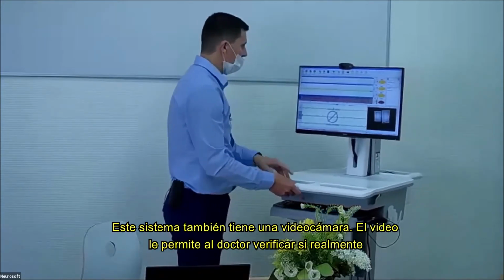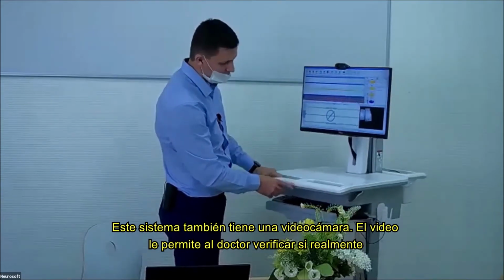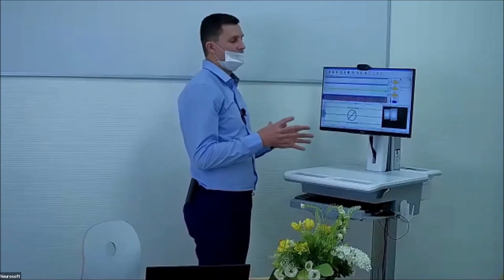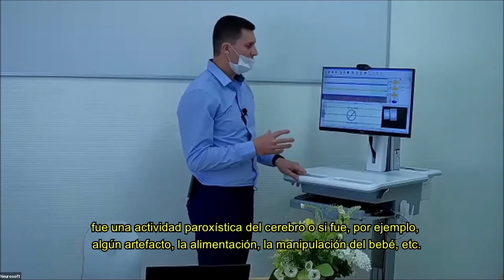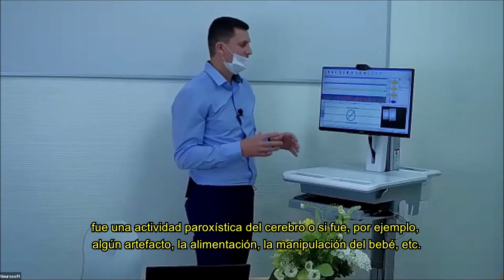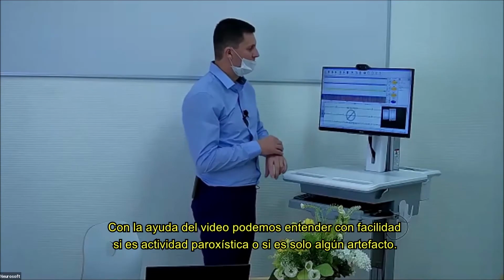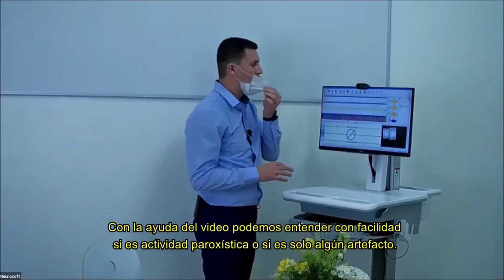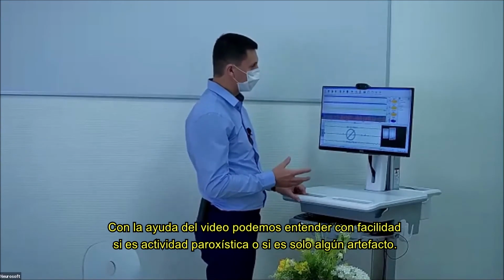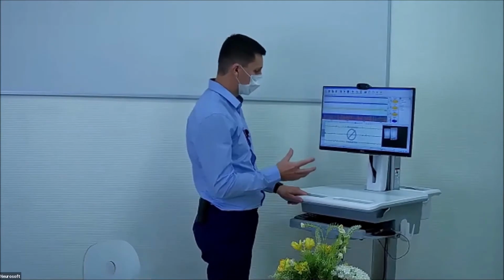Also, this system has the video camera. The video allows the doctor to check if it was really paroxysmal activity of the brain, or it was, for example, some artifact, for example, feeding, manipulation with the baby, and so on. With help of the video, we can easily understand if it is a paroxysmal activity or if it is just some artifact.